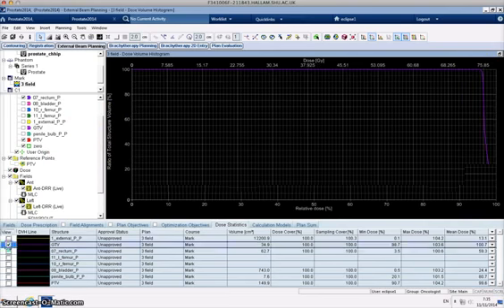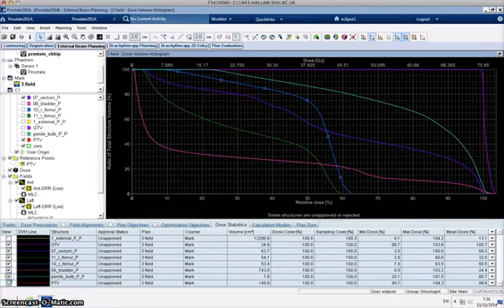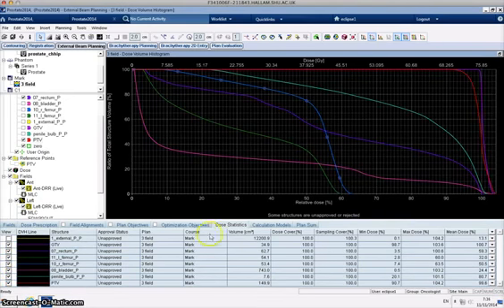And then we can turn our volumes on by clicking the tick boxes here, so we can see what all of our various structures are getting. And we can see that the screen can get pretty busy when we start turning everything on, so we can change the colours of those. But what I would do is only turn on the structures that we actually need, the ones that we're looking at that time.